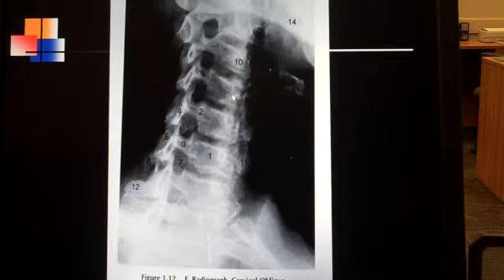I use the word circle in class to describe this on lecture material and on testing material. So this is the circle, and this is the bar. Number 10 is on the circle, and here would be the bar. So that is 9 and 10.